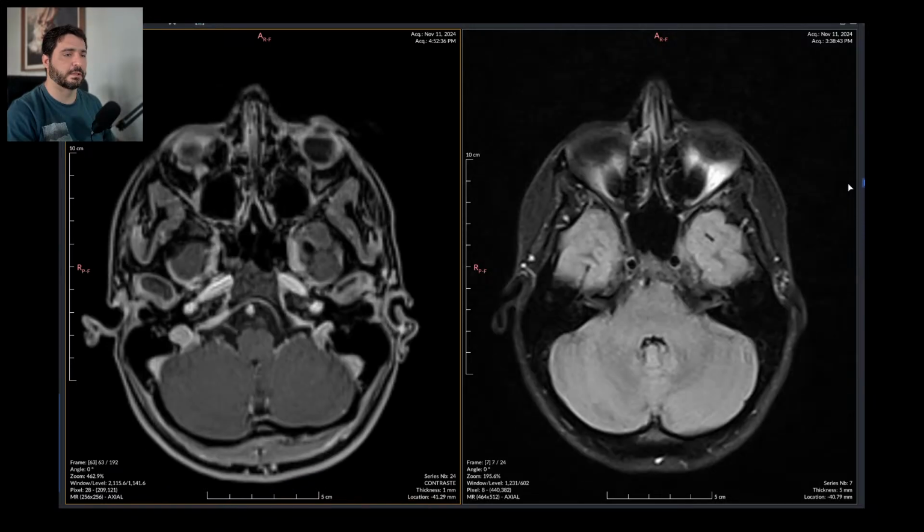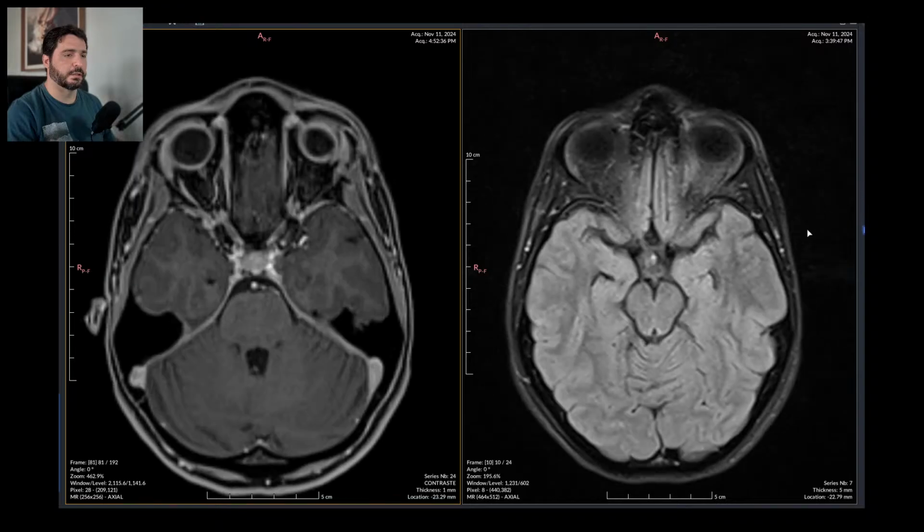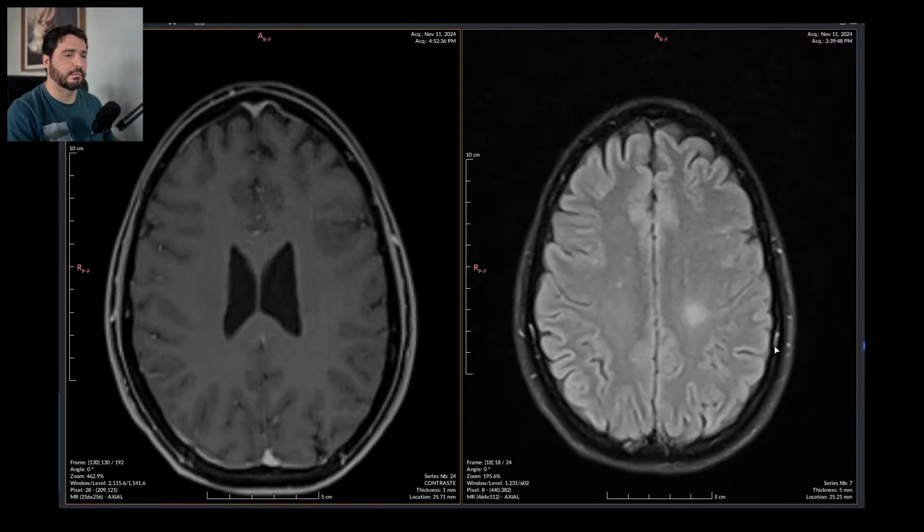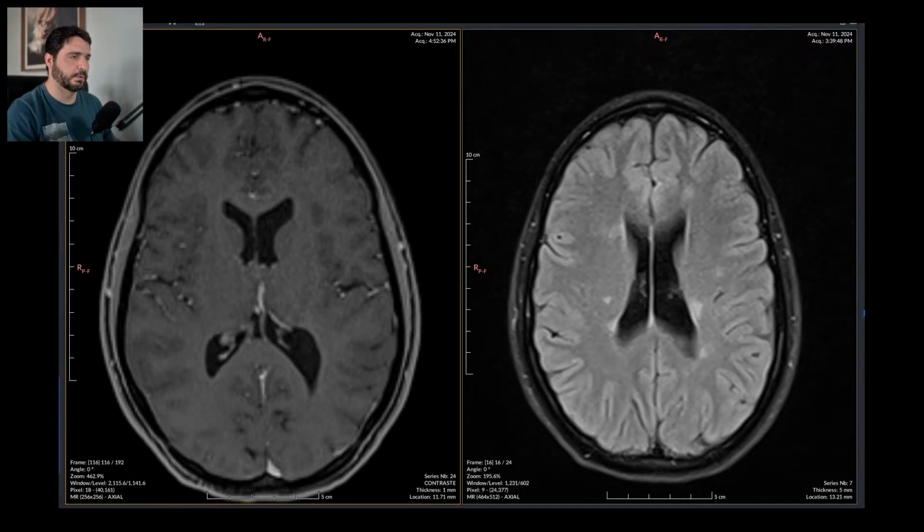It seems there is none. Yep, no enhancing lesions. This is November.